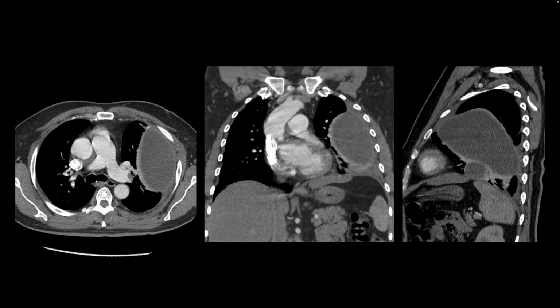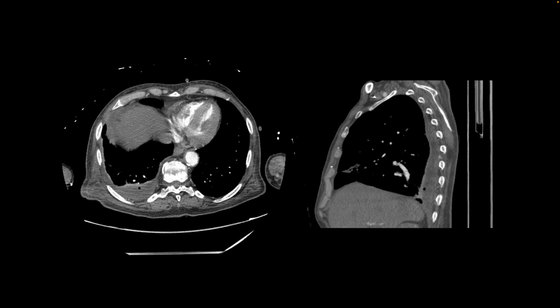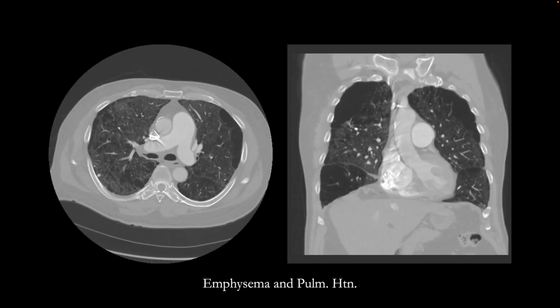This next patient has a loculated effusion with pleural thickening and enhancement, and so you want to raise a suspicion of superimposed infection or empyema. This patient has a focus of air, suggesting infection from a gas-producing organism, so again, suggestive of empyema. This is our next patient.